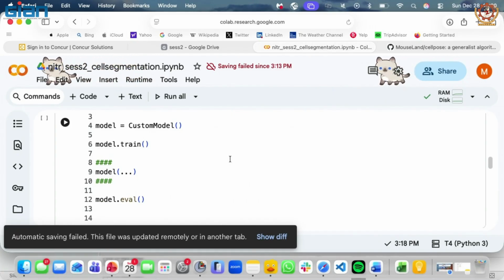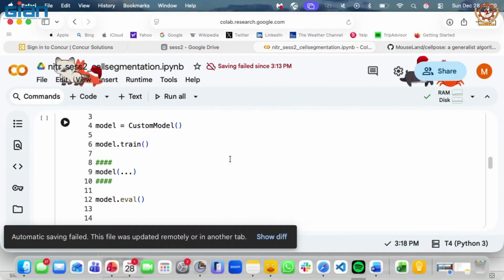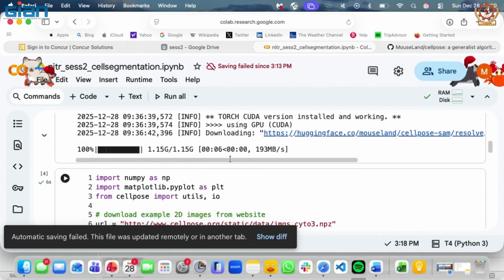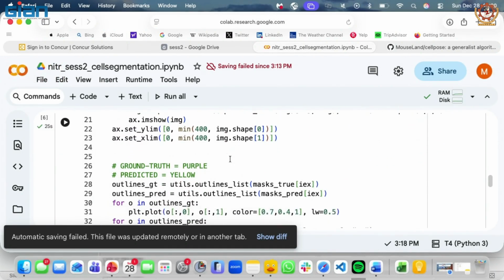So that name error means you might not have declared a name before referencing it. Anyone else getting the same error? No? In this step? Okay. It works? Okay, great. So name error basically means that you are trying to reference some name, but you have not declared it previously.